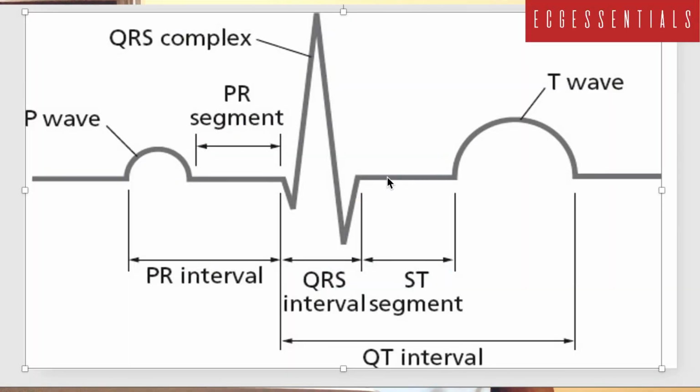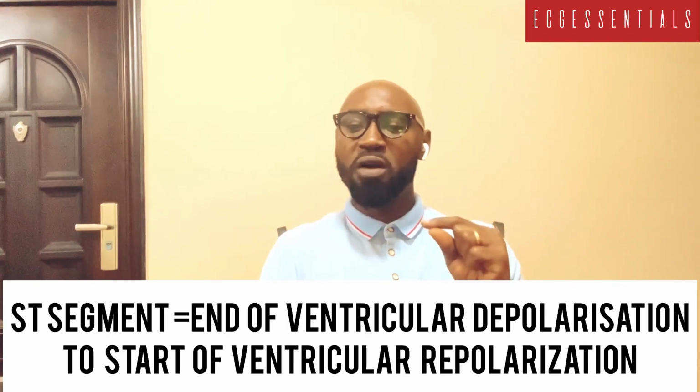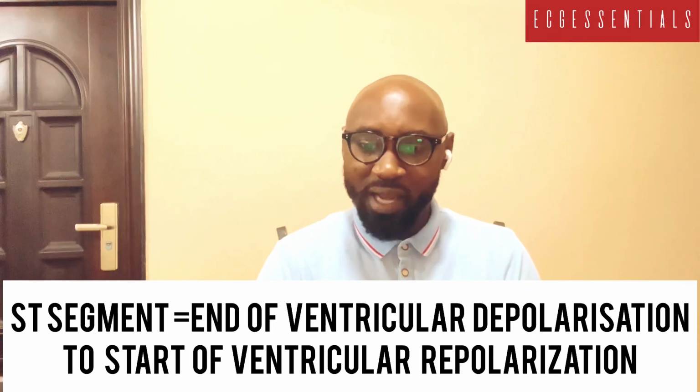The following straight line is the ST segment. The ST segment is that straight line connecting the end of the QRS complex with the beginning of the T wave. And this ST segment measures the time from the end of ventricular depolarization to the start of ventricular repolarization.